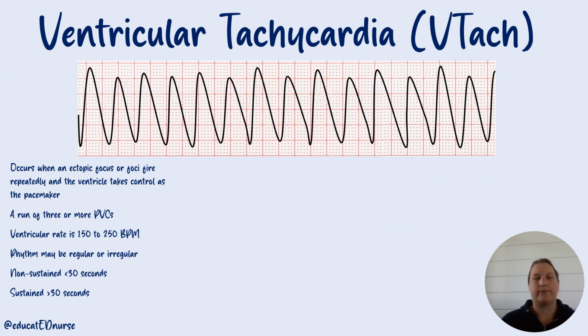All right, next up is Vtach or ventricular tachycardia. Oh, this looks scary and wide and bizarre, right? Yes, I would be scared if I saw this. I have only seen a couple of patients that are in stable Vtach. Most of my patients that are in Vtach are unconscious, unresponsive.